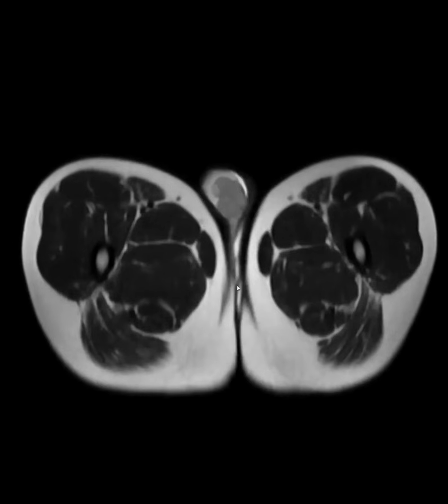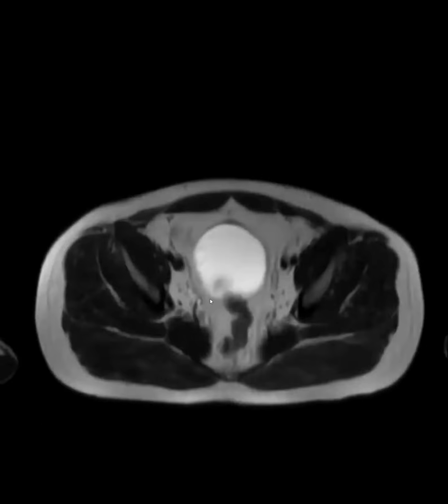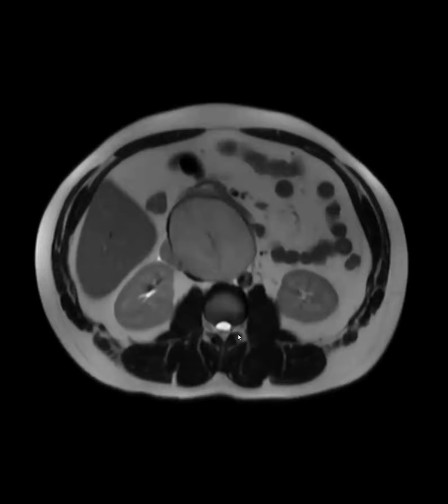So the teaching point is whenever you have a young male, always go check the scrotum, especially if you have a retroperitoneal process, because it can just look like a big mass and you don't even recognize that these are metastatic lymph nodes.